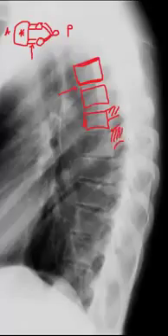Now, what do you know about the space that lives under one pedicle but above the other? This is the space in which I'm talking about. This is a circular region that's created by the pedicle at its roof, pedicle at its floor, body and disc in the front, and facet joints in the back. This is actually the IVF region, intervertebral foramen.